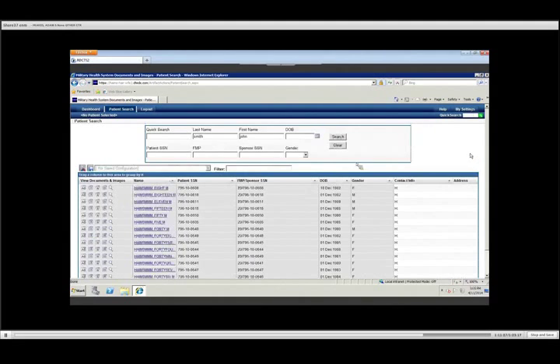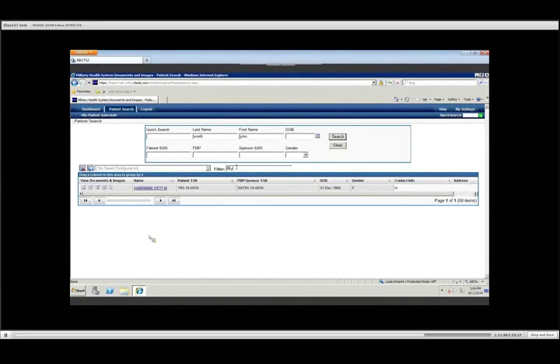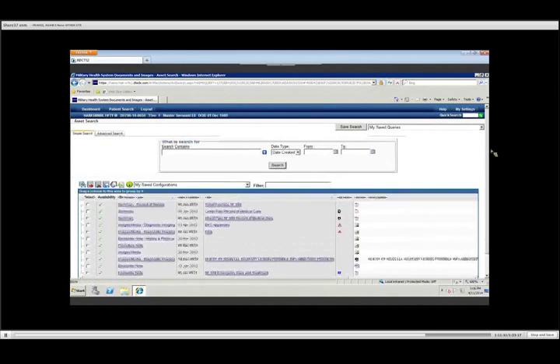I'm going to utilize my filter, and I'm going to type in 50, F-I-F-T-Y, and you'll notice HAIMS automatically filters for me, just like it did in AHLTA. Very quick, very simple. I'm going to click on HAIMS 50. Once I load this patient, this screen should look very, very familiar. It is the exact same screen, exact same functionality that you have when you are in AHLTA. The only difference is that you cannot paperclip or associate an asset. Obviously because you are not in AHLTA, you are in the HAIMS Standalone.